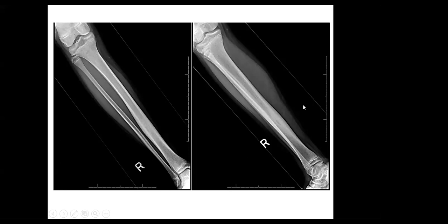The thickening at this side of the cortex with the soft tissue edema. If there is any change, MRI please, if present.